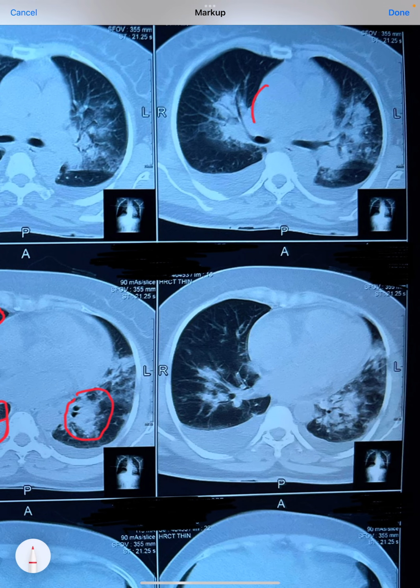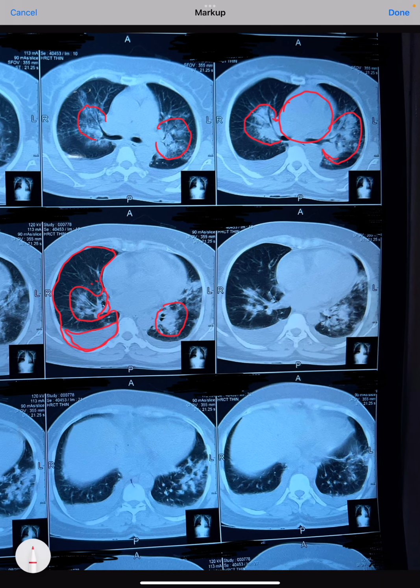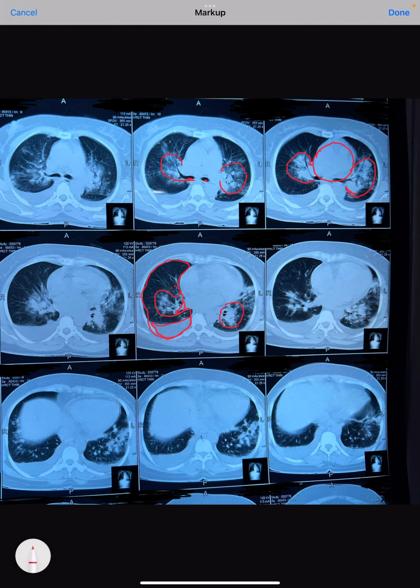First, this is the heart, and just at the hilum in the center, we are having some problem here on both sides. This is very typical of the perihilar area, from where the trachea divides. You can very nicely see the division of the trachea, and these are the two main bronchi that are emerging. The bronchovascular bundles go through here only, the pulmonary artery and its vasculature also go through here only, and the pulmonary veins are also present in this area only. So this is a typical perihilar involvement, and there is some problem here. We can very nicely make out.